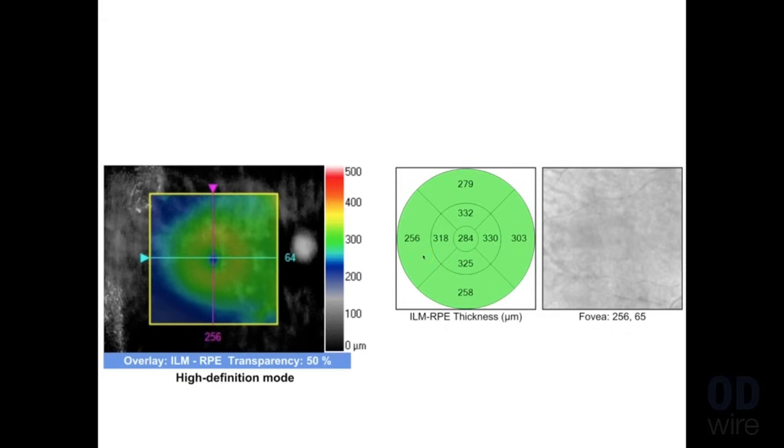It's important to realize that this green in this statistical analysis has very little to do with the green here in the colorimetric analysis for the maps. I'm going to show you more what I mean in just a minute, but keep that in mind for just a moment. That green on the statistical map is different.